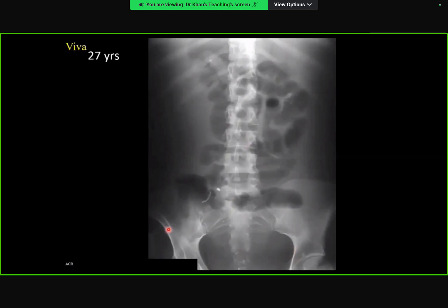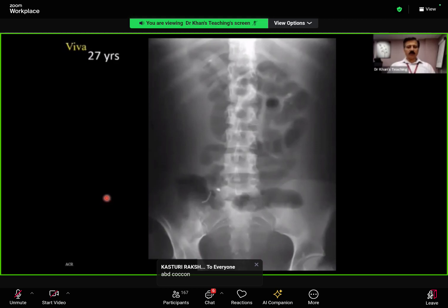In the center of the abdomen. Excellent. So, conclusion. So it's small bowel obstruction with the... yes, I like that when you said that they are in the central part of the abdomen. So, yes, hint is that I like that.